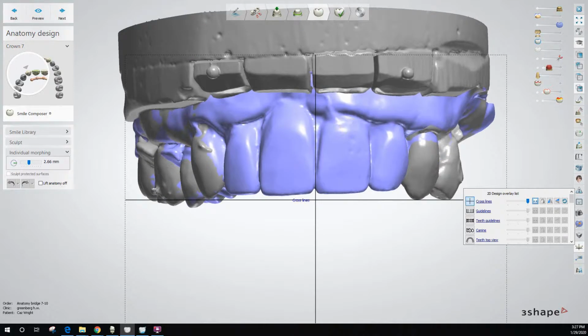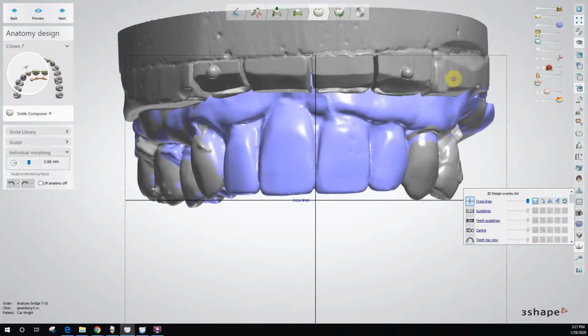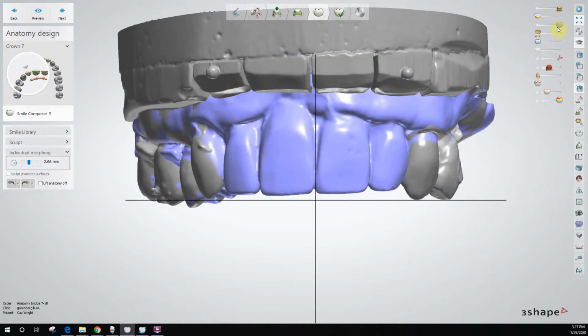Okay, I'm going to go look at the email. Okay, there's no email for length, but sometimes it'll give you a length to measure for the centrals and the laterals. Okay, so I think I've got a pretty good setup here. Turn this off, and I'm going to turn it back on, and I'm going to reset that. So now I come back to that spot every time. Now I'm good to go for design.